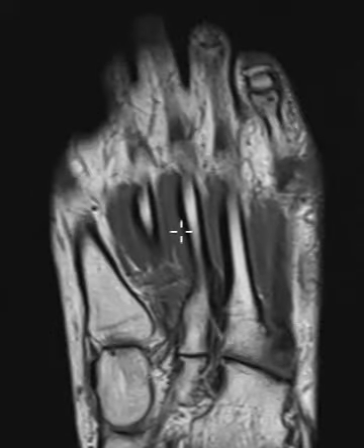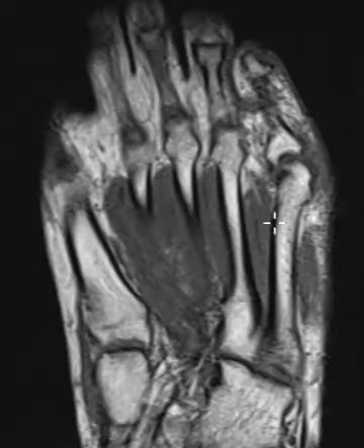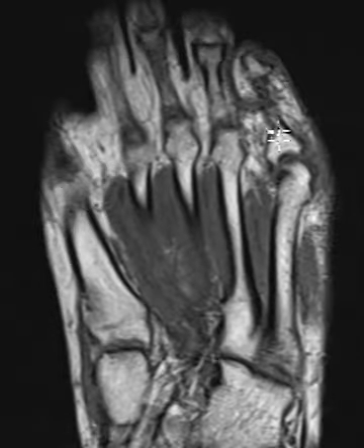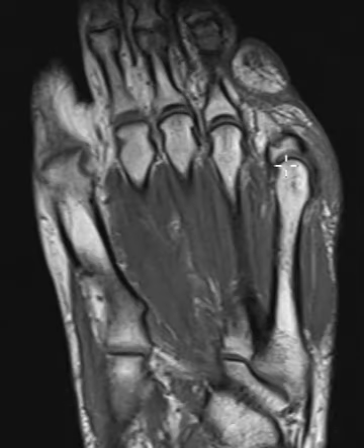We see the metatarsal bones here looking normal. There's no evidence of a stress fracture. This is that fifth toe they're really worried about. It looks normal, no fracture, no stress fracture.